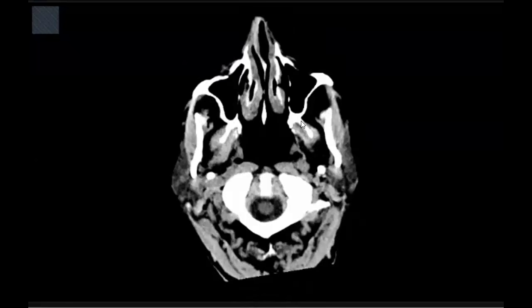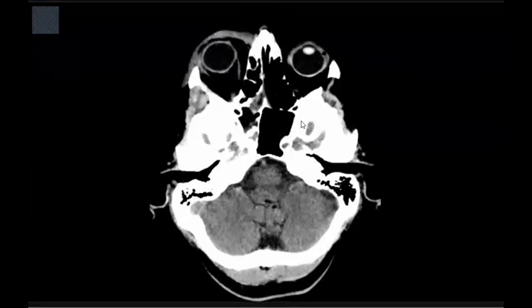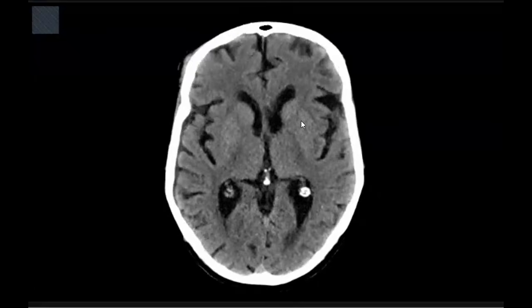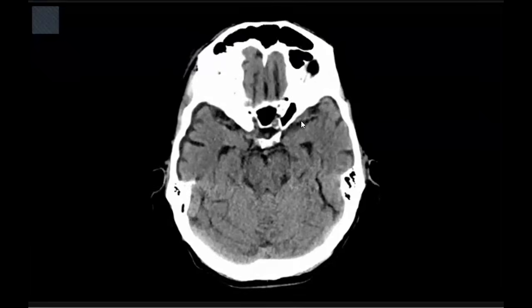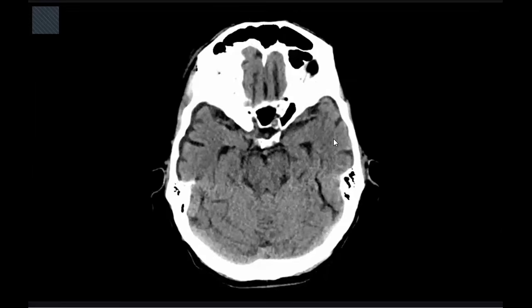No midline shift. No hydrocephalic changes. The only abnormality identified is abnormal high density signal seen in the left temporal lobe. Maybe this is a cavernoma or arteriovenous malformation.